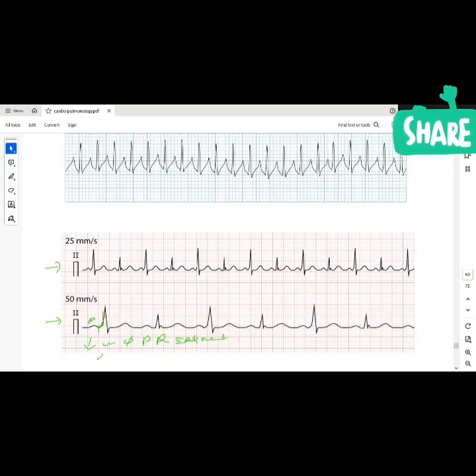Then, like you mentioned, there'll be a slow upstroke of the R wave, the QRS complex, and that creates the delta wave that we have here. And then you're going to see a wide QRS complex, wider than 3 small boxes, up to 1 big box. Because of course, if I bypass the normal conduction pathway, the ventricle will depolarize slower than usual. So the wide QRS complex.